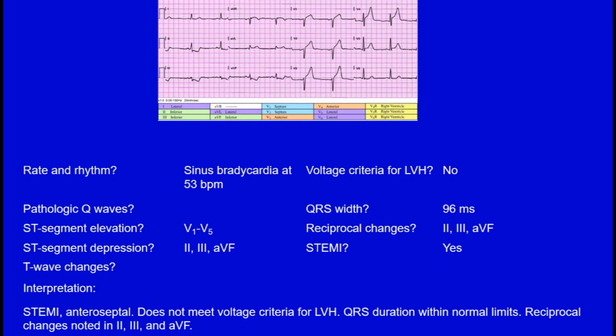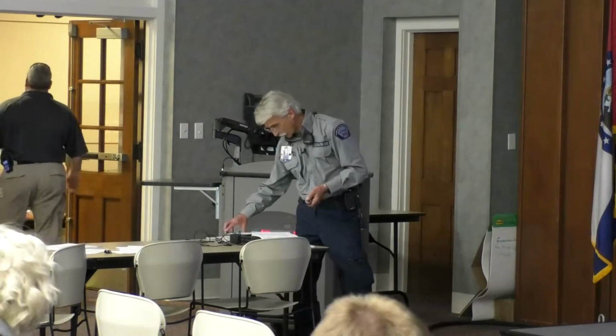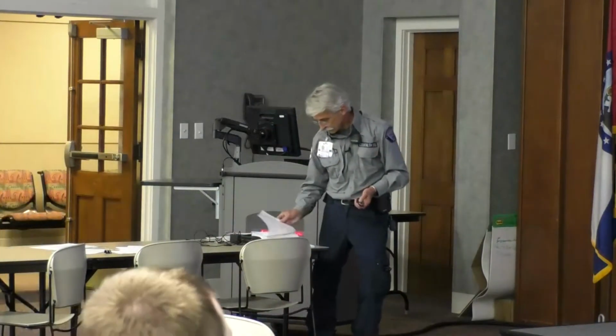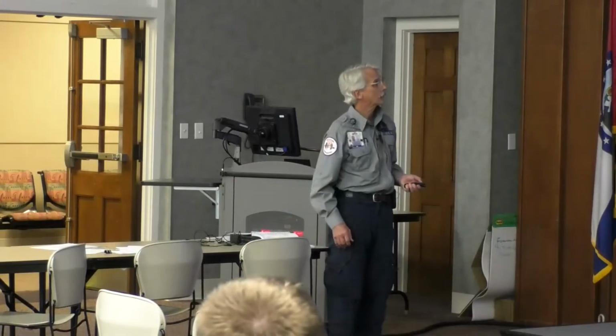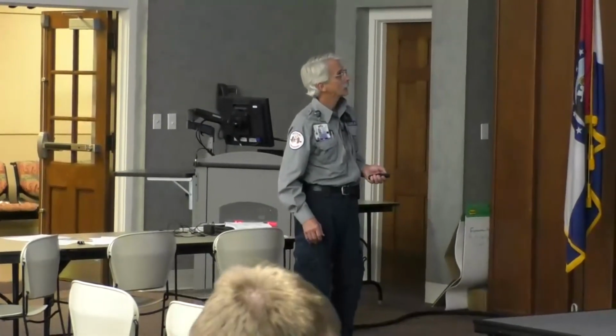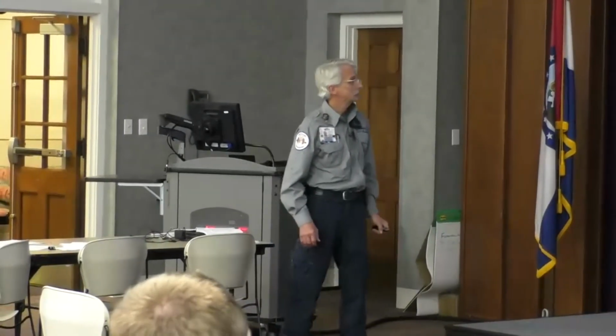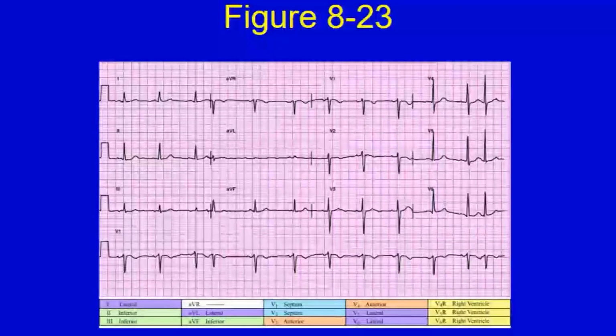You see where I'm going next? I must have turned the pages. There you go. How about this one? Rate and rhythm.